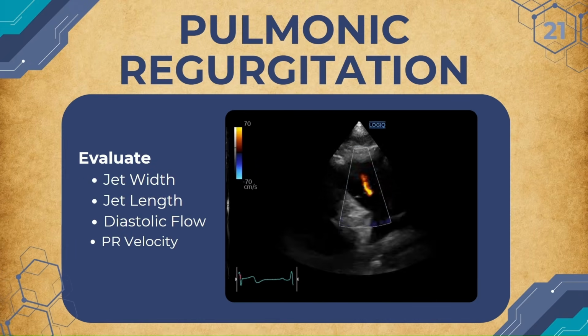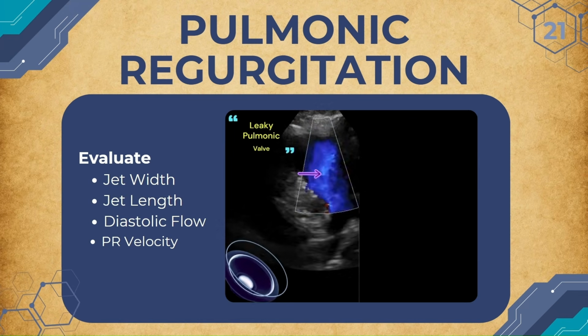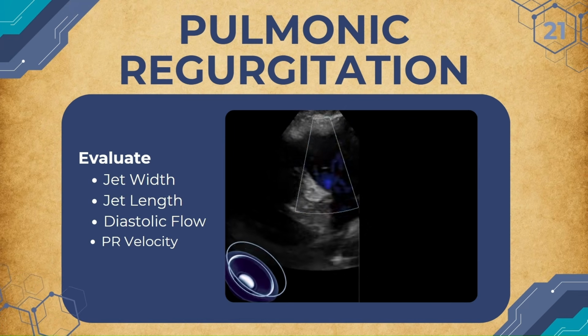What I want you to remember, when assessing pulmonic regurgitation, ask yourself 3 questions. How large is the color Doppler jet?